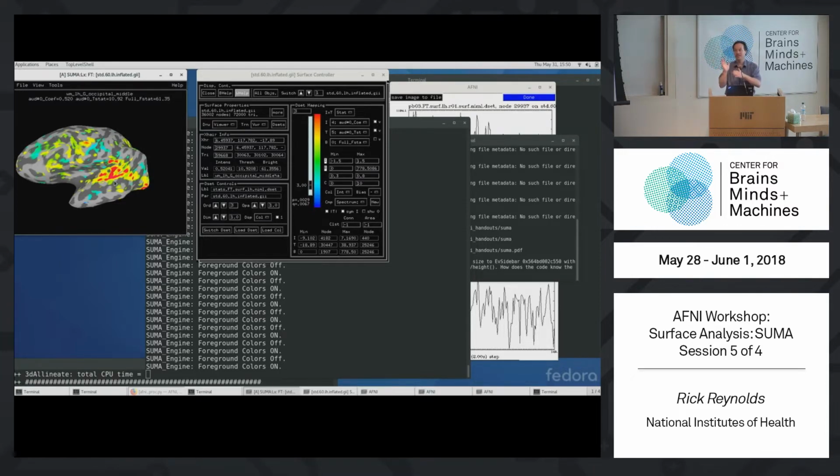Anyway, something so sharp and strong looks nice, and it's probably not going to be that nice in a volume that's mixing all your tissue types together, and all your sulcal patterns will be mixed across Euclidean space.